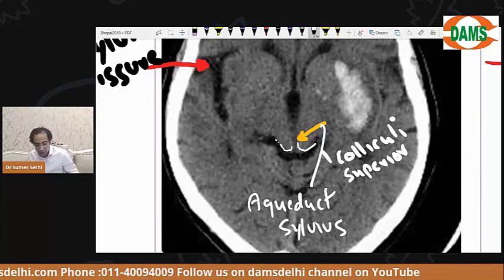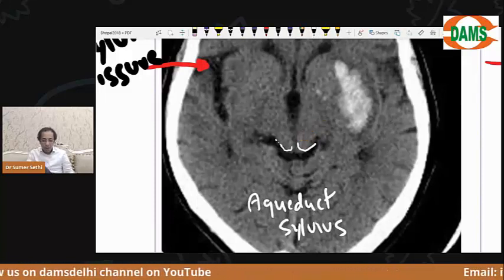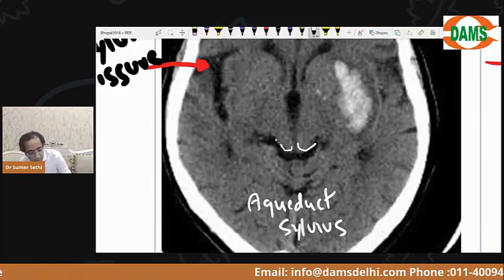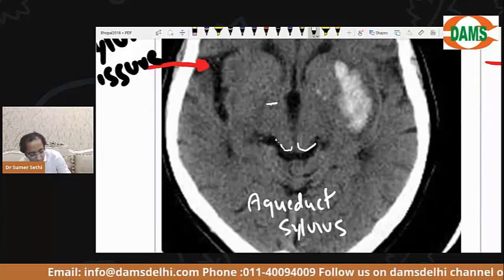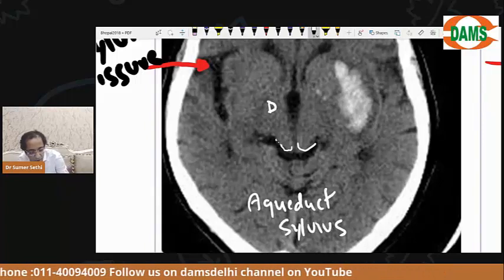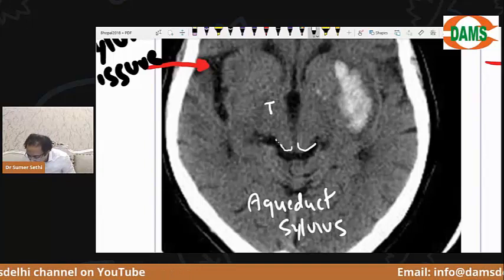Brilliant, very good. I guess you're so intelligent. I'm so happy with you. Now please see. Just see and answer. Children, look. This is the area of the diencephalon, or we can say thalamus. I'm saying a broad word, thalamus, here.